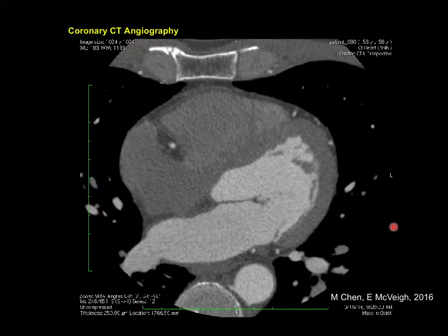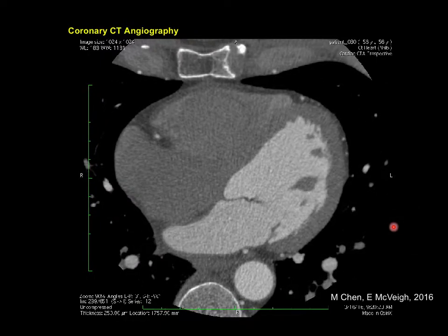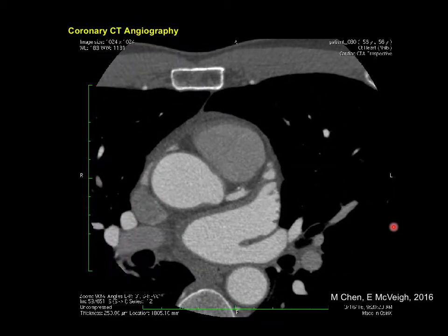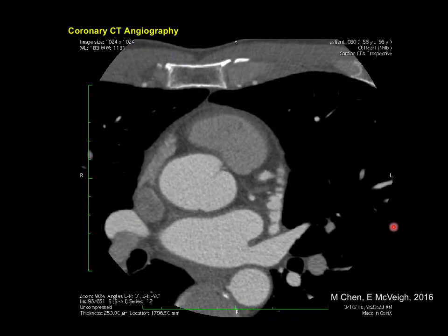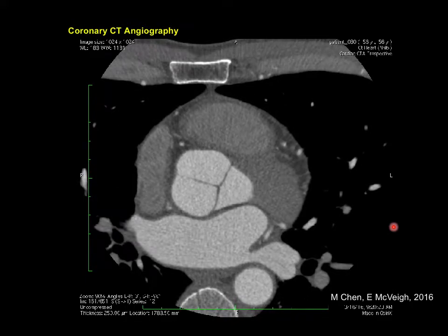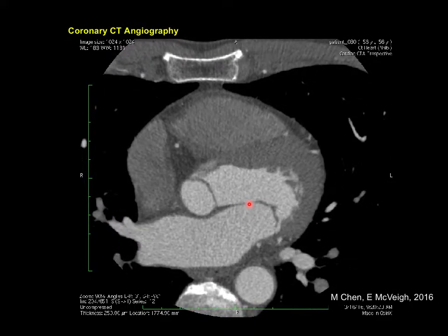So they doubled the number of detectors in theta, and they doubled the number of detectors in Z. That's a huge change in spatial resolution, a factor of 4, and the question is, would you see any difference in these pictures, or is something else basically limiting our resolution?